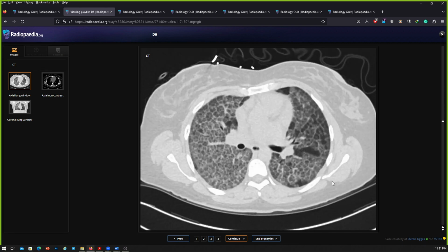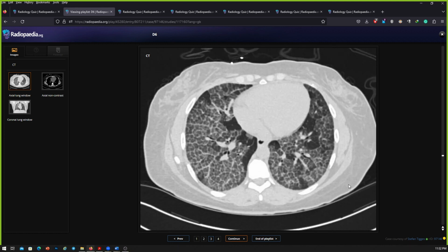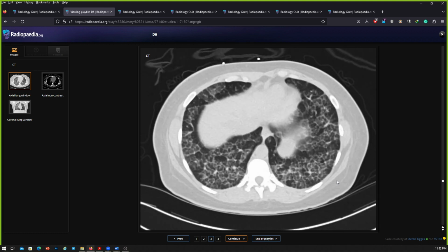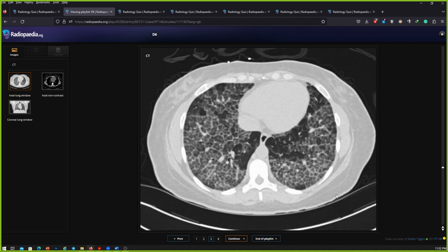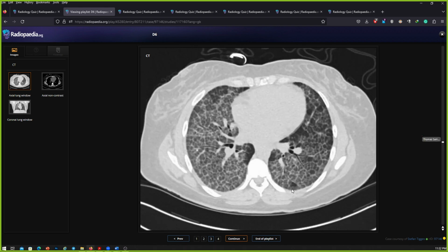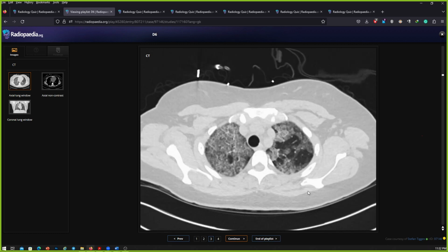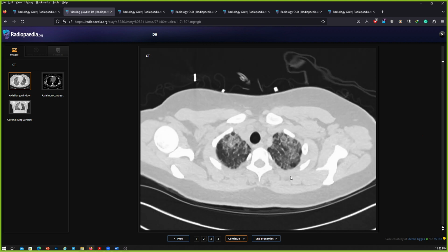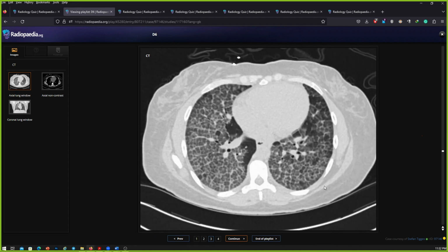Okay, so I've been provided with the CT chest images, and I can see that there is a crazy paving pattern of parenchymal disease, as there are thickened interstitial septa with some areas of air trapping, which is involving bilateral lungs with no specific zonal predilection. There is relative sparing of the bilateral lung apices. I can't see any pleural effusion or pneumothorax.